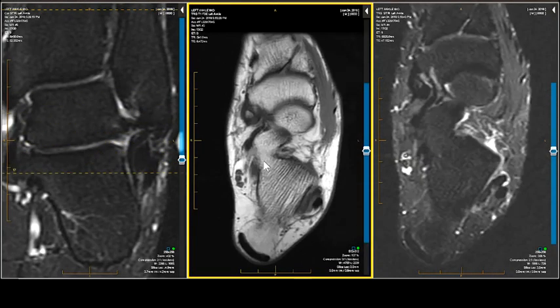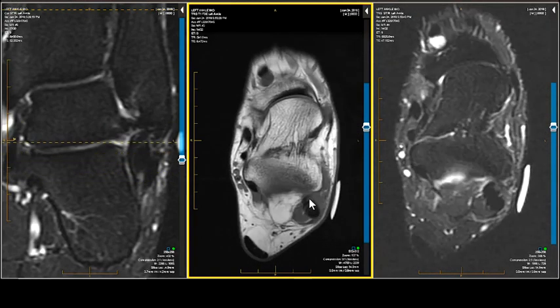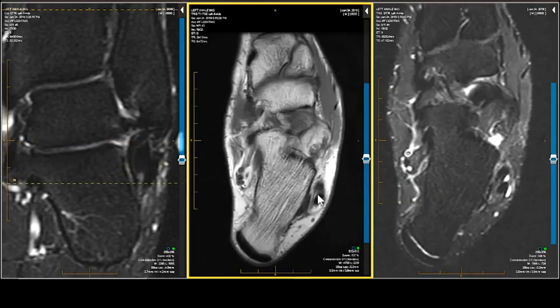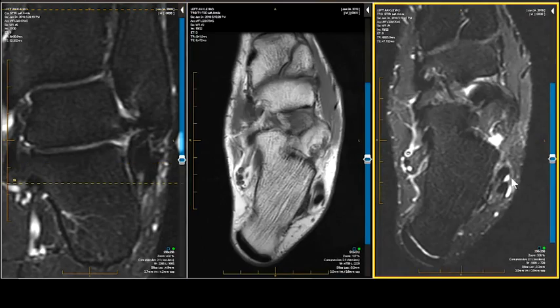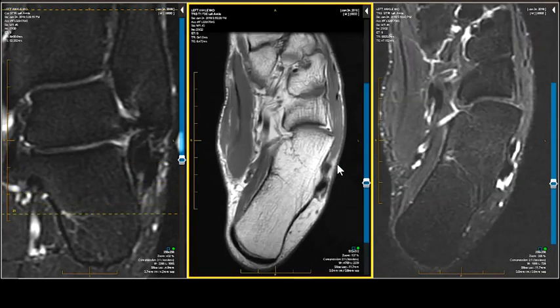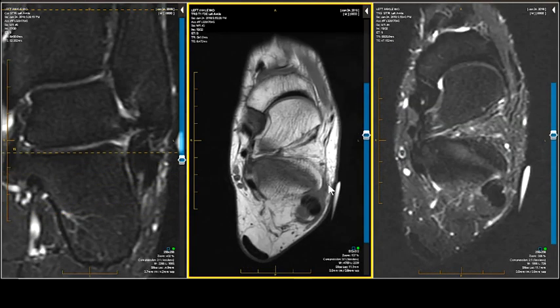How about the lateral peroneus longus and brevis? Well, the brevis looked funny because of this accessory muscle, but it's okay. You have to wonder why the patient has fluid around the peroneus longus and brevis. So you want to check for a retinacular injury. Got it. Right there. Too gray, too swollen, too stretched out. He's got a retinacular sprain.